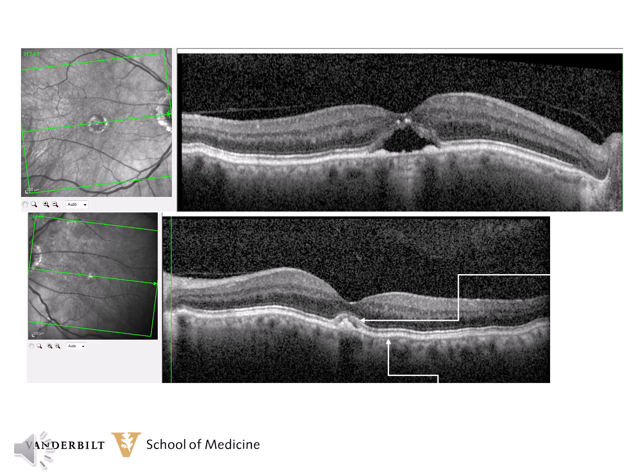The OCT of the right eye shows what could be subretinal fluid from central serous retinopathy or choroidopathy and some irregular RPE under that hyporeflective area. Again, that could be interpreted as central serous choroidopathy or neovascular age-related degeneration. The left eye OCT, however, gives us the diagnosis. Here is the typical subretinal pre-RPE hyperreflective area. Now the right eye makes more sense, showing the liquefaction of the vitelliform lesion and not an exudative reaction.